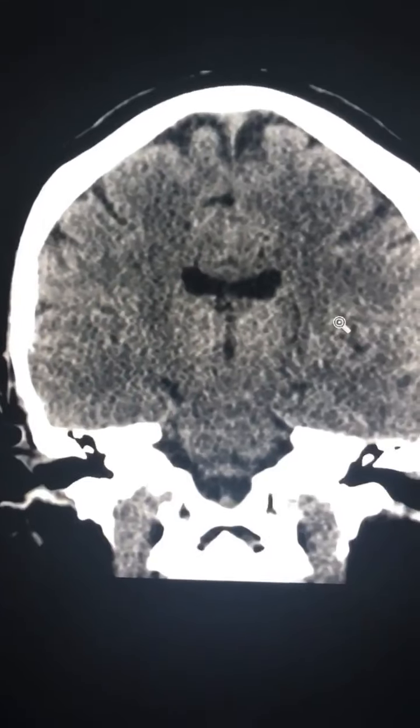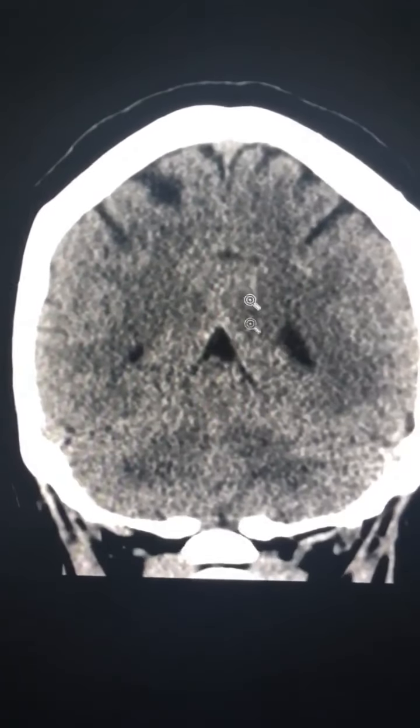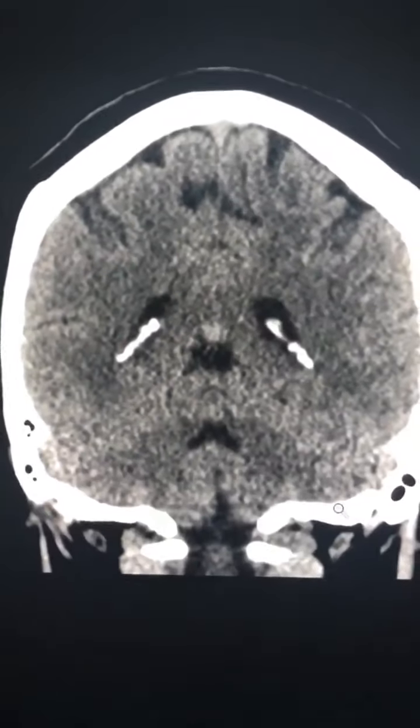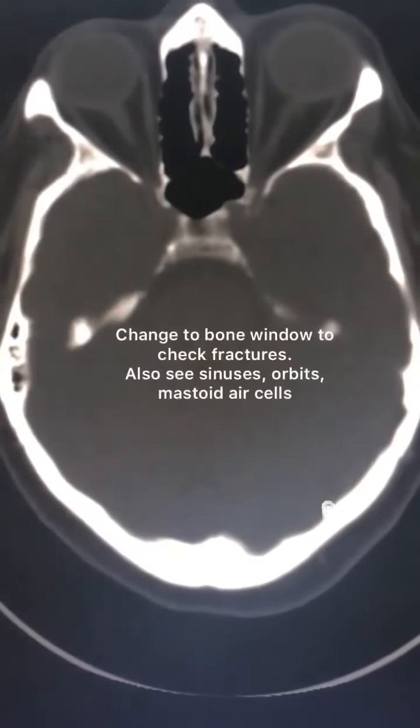Then you see the coronal one, where you can look for any tentorial herniation. You can again check that you are not missing any stroke or anything. After doing everything, go in the axial, go to the bone window, look from the top to bottom. There should not be any fracture.